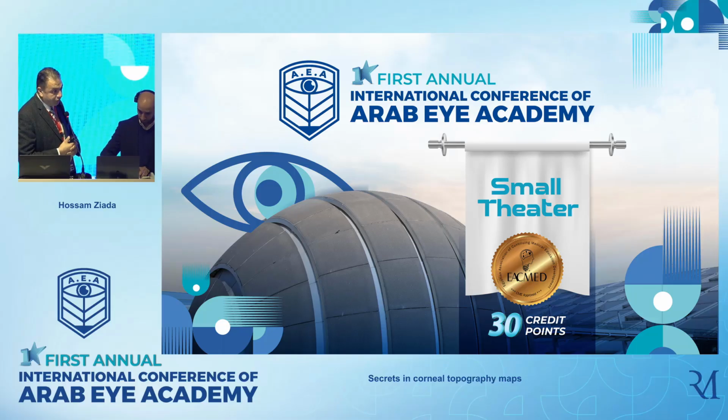Now I'm going to present the second presentation, okay, about the new tools to complete what I'm talking about, the inferior steepening in the anterior surface of the cornea. In the past, before having the epithelial mapping, any inferior steepening was suspicious, and we may exclude the patient from the inferior steepening test.